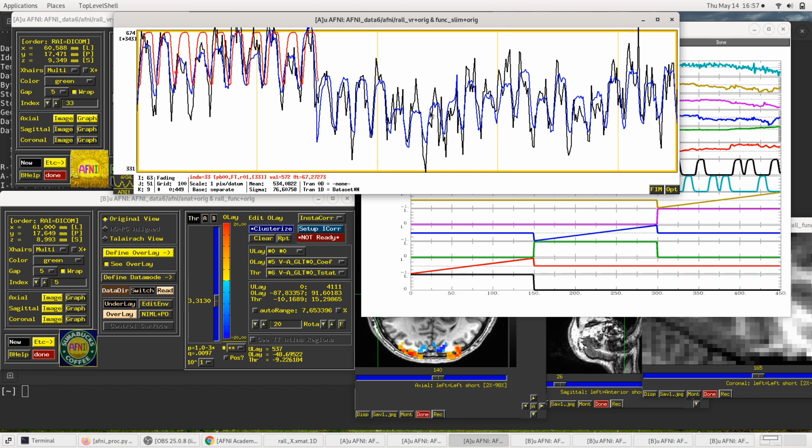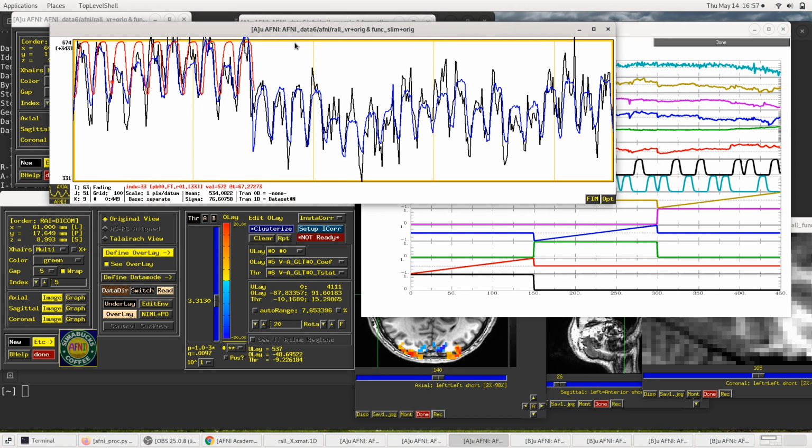And then the blue curve will be the fit, and the residuals will be the difference between them. And the residuals, like the beta weight with respect to the residuals, will give you some t-stats or f-stats or whatever. Or I guess not f-stats, but t will be that ratio.